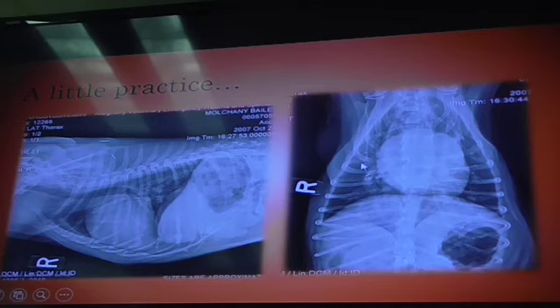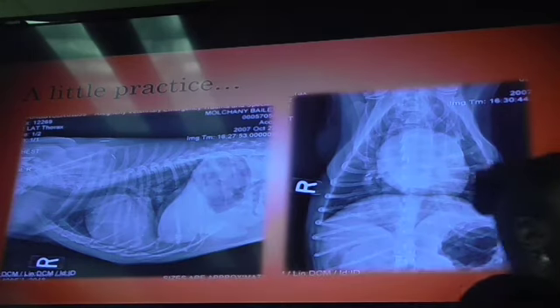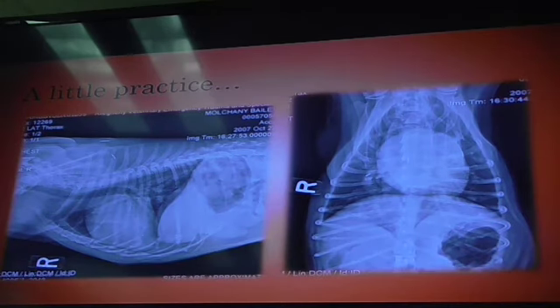Or sometimes you can see it going to the right middle. All right, but this going down is a trachea, and then it bifurcates. This area is actually important because of what lives in between there, remember I said left atrium sits on midline? Also, it's your mediastinal lymph nodes, okay? And then some of those pulmonary vessels coming out the heart, okay?